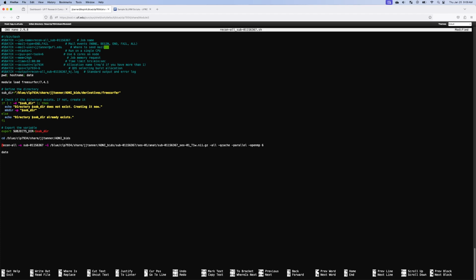And so just like that, I can have an updated script. Remember, I had already edited 6367. Because everything else is consistent other than just the name, this will process that individual. Now there are other even faster, more automated ways to do this. If you have to do it for a lot of people, there are ways to do this in a loop, and find and replace and all of that. We won't worry about that, but now we have a second script.